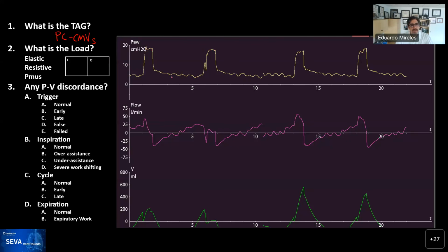There's no other, I mean, the classic thing that is in many books that shows the drop in pressure before the breath, I would say it's not a completely trustworthy way to assess that. Sometimes you'll see it. But in this case, this mode of this ventilator in particular would show you little arrows, and you'll see it in an example later on.